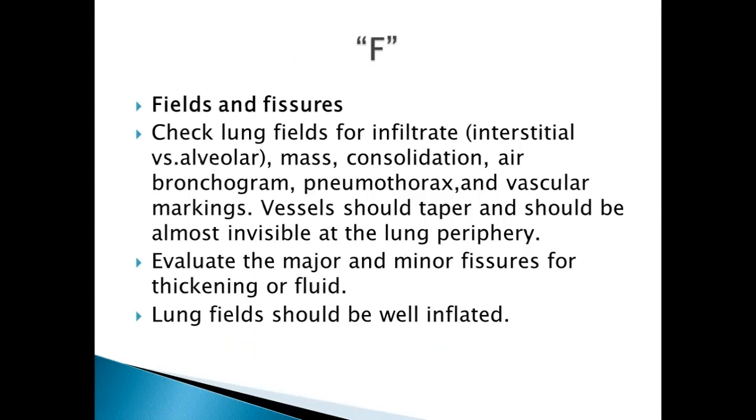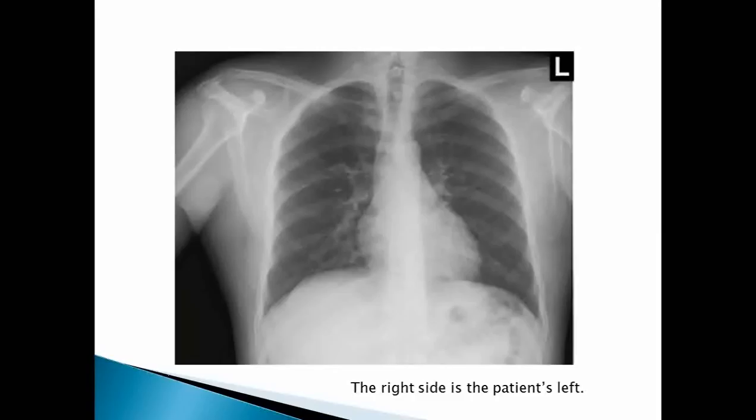Just a reminder, the right side is the patient's left. So as you're looking at this chest x-ray, your right side is really the patient's left. So it's almost like they're facing you. That's how you're looking at the chest x-ray. Thank goodness they put a big L up in the corner for some of us.